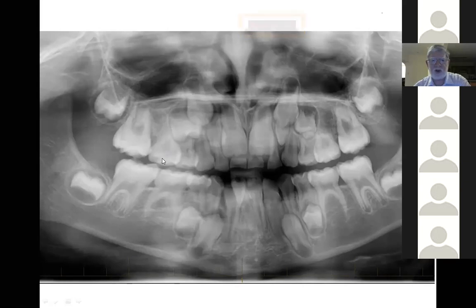In this particular case, you can see all the second premolars, the 5s, are missing, and the patient's really bunched up there. I don't know, overall in the grand scheme of things, whether space is going to be needed and whether those E's will be sacrificed. You can see that 2-2 coming down. It's trying to sneak into that little space. It's rotated a good 90 degrees. We're probably seeing it mesial to distal or distal to mesial rather than buccal to palatal like that.